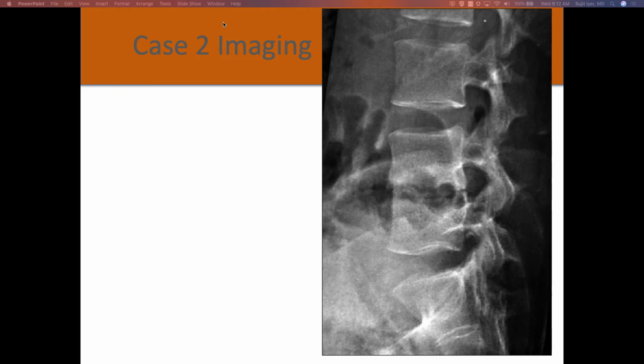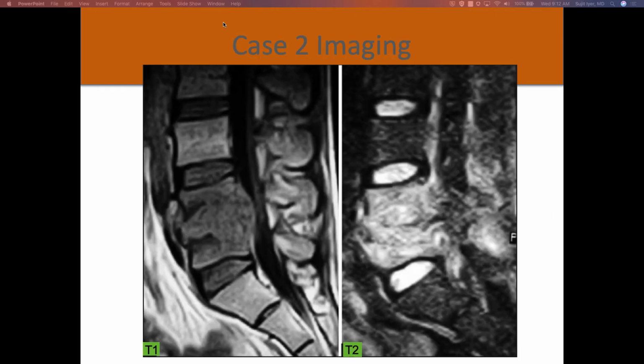And then after this x-ray, you end up moving to get an MRI. Any thoughts, Jason? Here's a pointer if you'd like to use it. I know it's a lot of things to hold. Sort of unable to distinguish, increased signal.